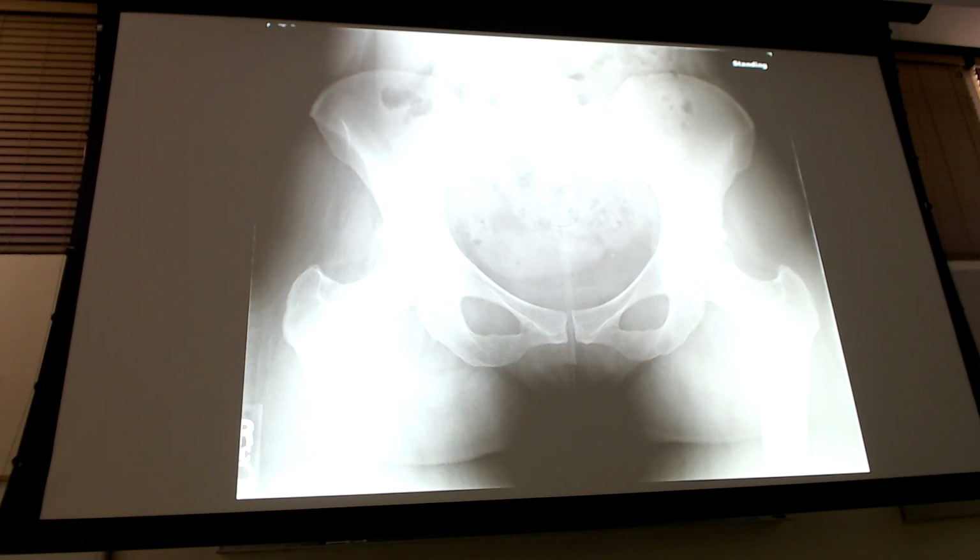Need more time? All right, you ready? It's a normal x-ray, everybody. It's a normal x-ray.